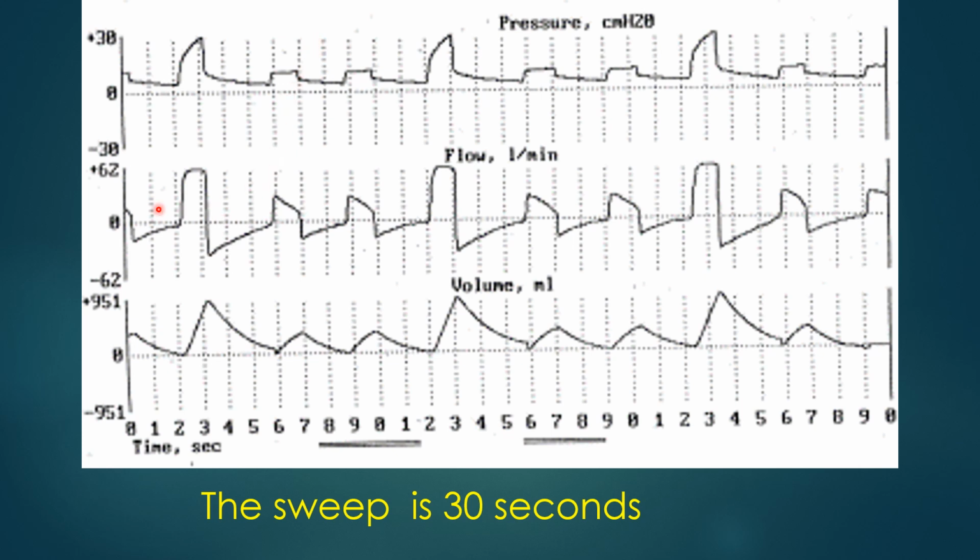And when we look at our flow scalar, we can also see the difference in the breaths. Here's our volume controlled breath with constant flow, square flow wave, and the patient exhales, and then here's our spontaneous breath. Remember, if you have a machine, a mode, or a breath type that you're delivering at constant pressure, then the flow will be decelerating, whether it's a pressure controlled breath or a pressure supported breath.